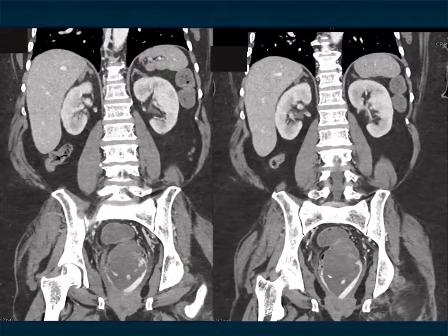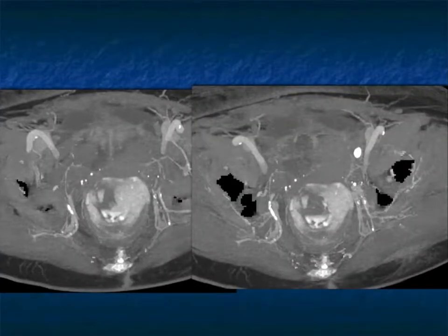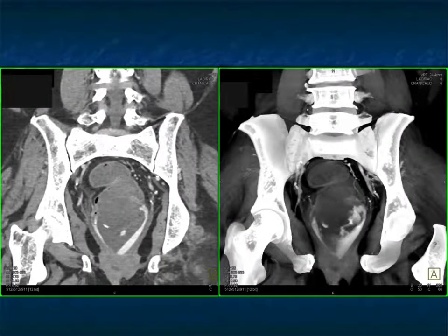Sometimes when the radiologists know precisely, like IMA in this case, where the bleed is coming from, they will embolize the patient so they don't have to come back a different day. And here I removed the bony structures. You can see how impressive the bleed around the rectum indeed is. And as you go to venous phase, look how much more extensive that blood is. Very classic active GI bleeding in the rectum. And here again is some late coronal venous phase imaging showing the active bleed, particularly on the left side of the patient's rectum.